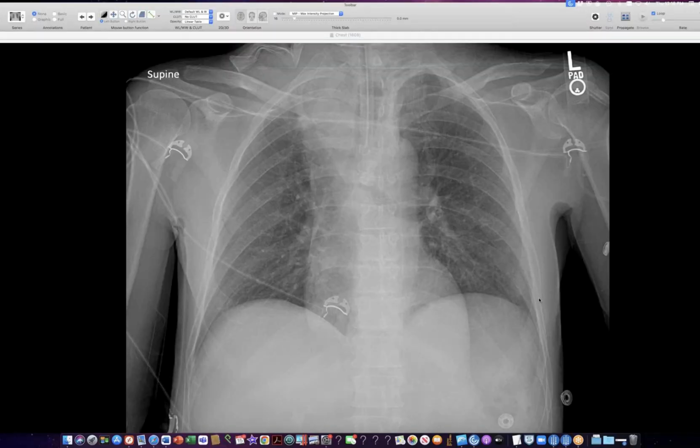Can people see an abnormal chest graph? Yep. So I encountered this patient yesterday with this mediastinal enlargement here, which seems to go pretty far high. It goes way high above the clavicle, meaning it must have a posterior component. And there's also kind of a drain flitting around here.